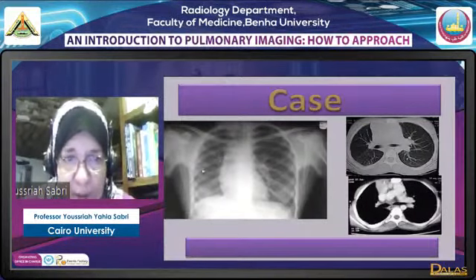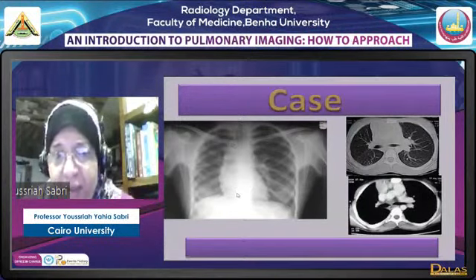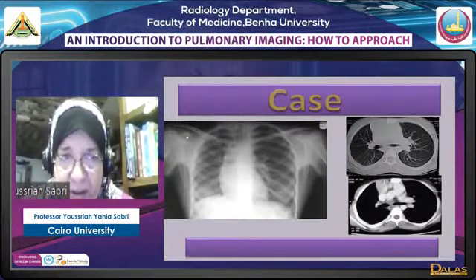Now what do we have here? We have a small lung on the right side. We have shift of the mediastinum and heart. We have abnormal configuration of the mediastinum and heart. This is a child actually, you can see the epiphyses here.